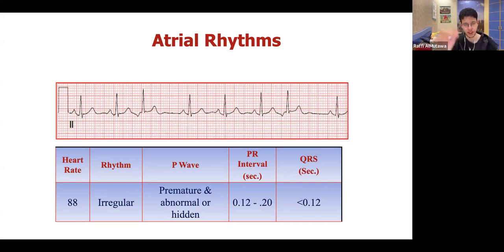Before you tell me what the arrhythmia is, tell me how you would do the heart rate for this.